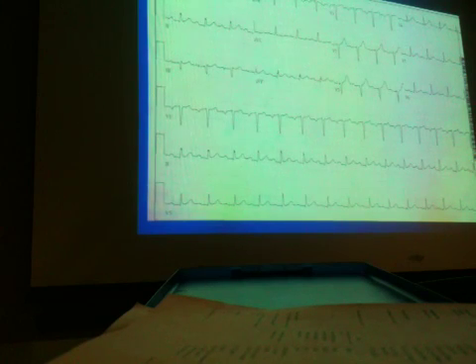PR interval. Okay? Remember, she sleeps in the second bedroom because she can't handle the CPAP machine. Or because, that's maybe wearing off in the marriage. Okay? So rather than the P wave sort of hugging that QRS because it's supposed to be very close, it's further away. Okay? There's more space between the P and the QRS.